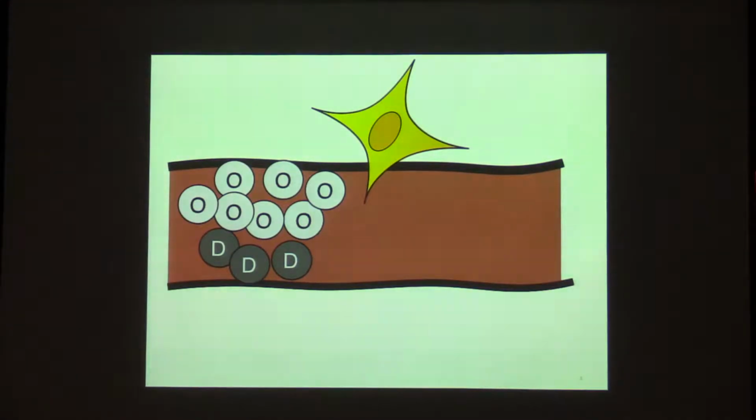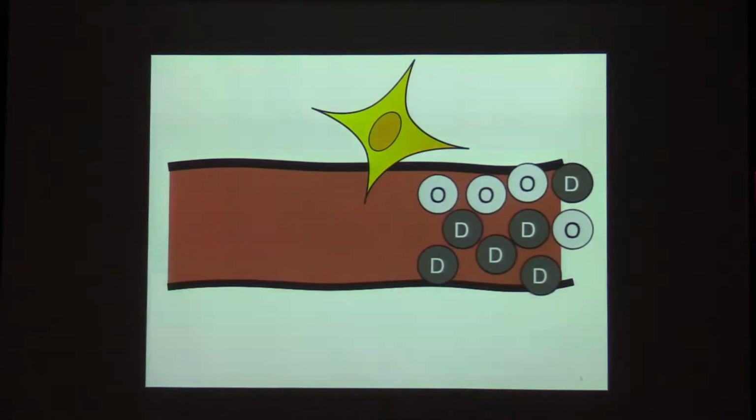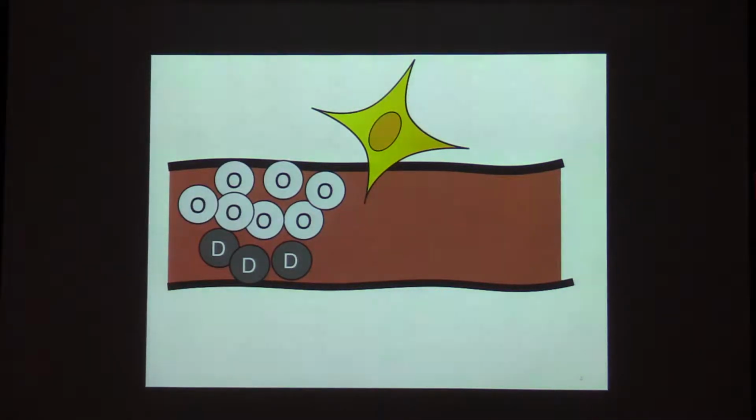And then this phenomenon of the BOLD effect. Let's say you have a neuron that is active, right? And you have the blood vessels in there. The oxygenated hemoglobin, which is bright on BOLD imaging, you saw that in the beginning. I'll just replay that. In the beginning, there was a little bit more oxyhemoglobin than deoxyhemoglobin, right? So deoxyhemoglobin is dark, oxyhemoglobin is bright.